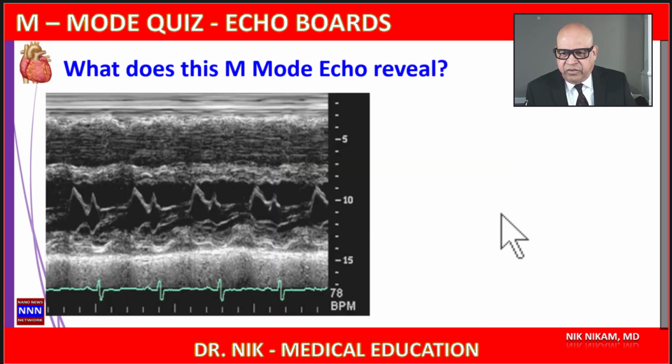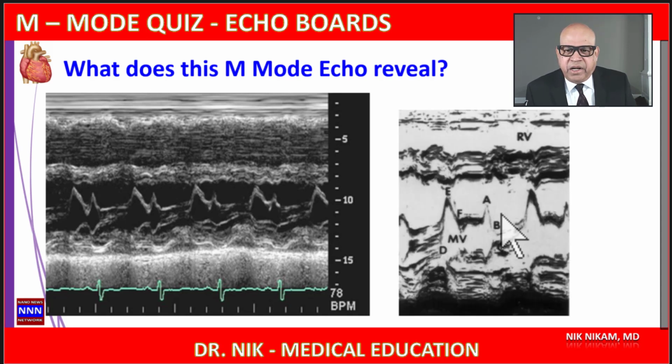Now here is an M-mode picture. I just want you to take a moment, pause the video, write down what you see, then we will make a progression further.